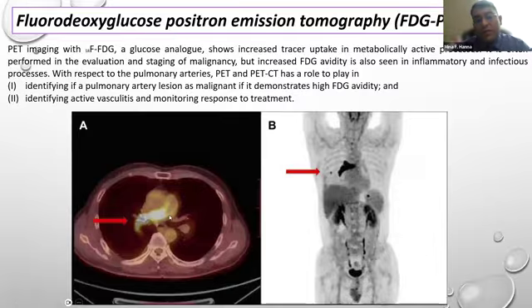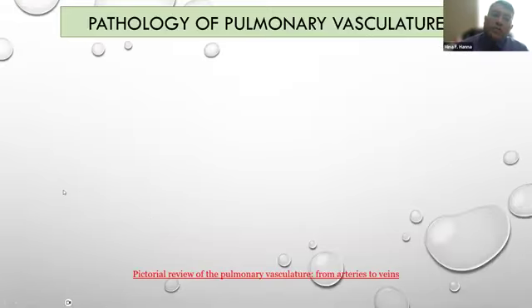In this patient, we suspected pulmonary embolism, but the lesion was enhancing, not like a thrombus without enhancement. So we did a PET-CT. You see how the lesion is very metabolically active and takes up the FDG, and you see the lesion here, and another lesion in the lung as well. There may be another lesion in the spleen here as well. So it is helpful for tumor evaluation.